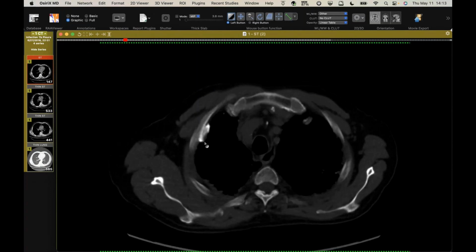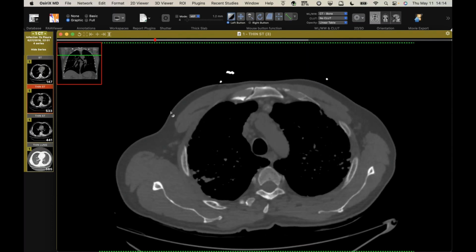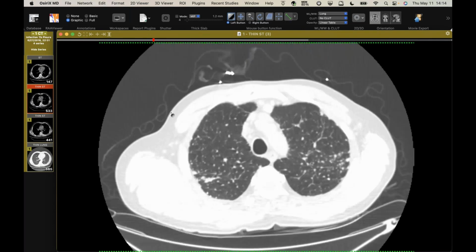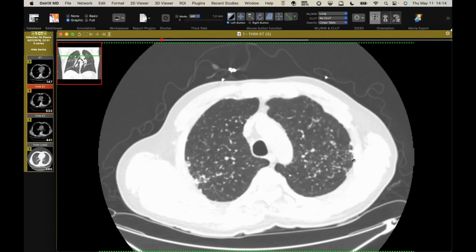Okay, good. So school teachers are exposed to asbestos in the ceiling tiles. Most of the old school buildings have asbestos in them. So it could have been that. It could also have been some remodeling project at home. Speaking of pseudoplaques, they're not the best examples, but when you get conglomeration of these subpleural nodules like this, they form the pseudoplaques.